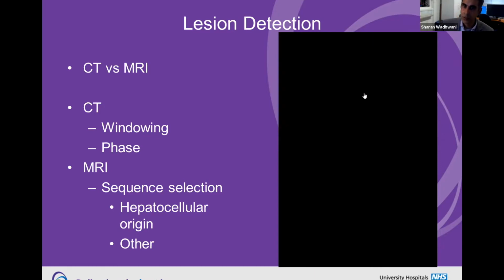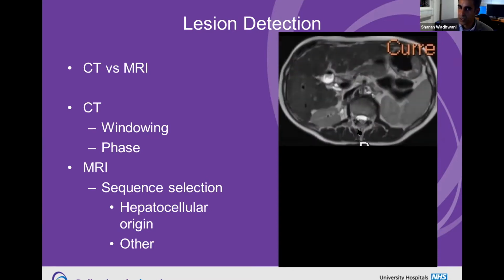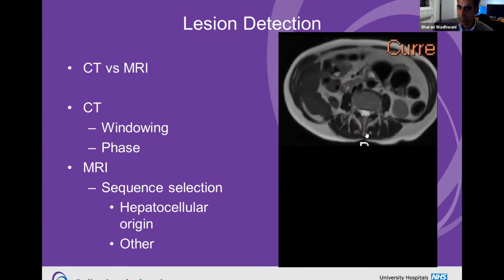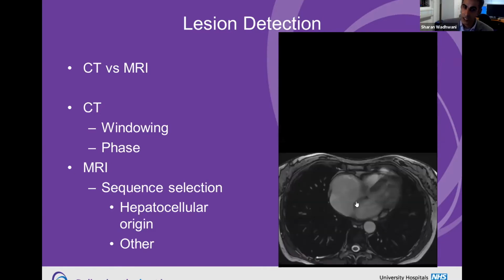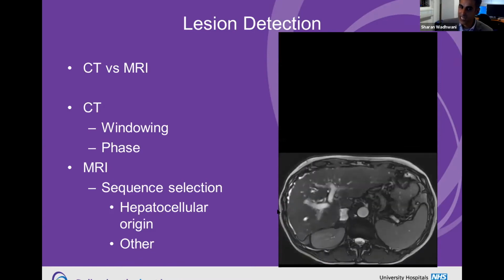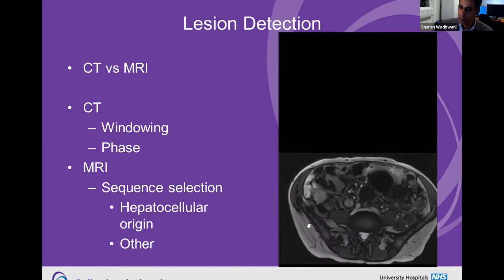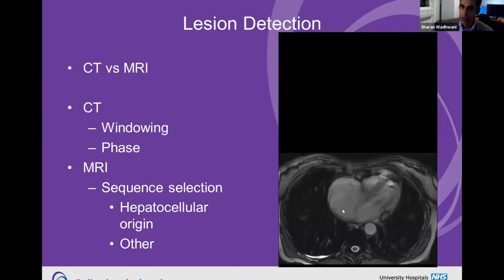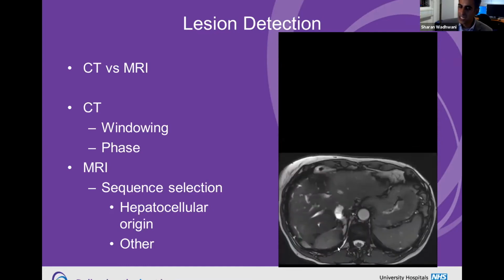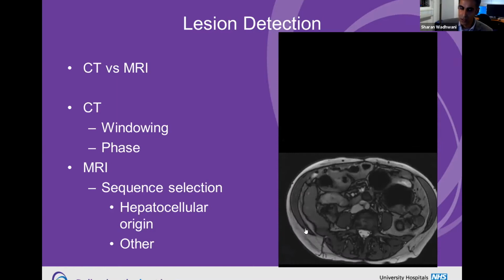That was a T2. The way you can tell it's a T2 is because the CSF around the spinal cord, which is sort of an easy go-to area, is bright, okay? Here's another T2 of the same patient at the same time. And you can see there's less breathing artifact here. There's less motion. You can see that you're covering the liver much better. It's a different type of T2. And basically with any T2, you can see that the fluid is bright. That means it's a T2.